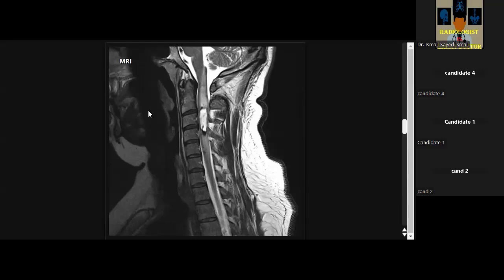To rule out what other lesions do you want to look for in such a case? If it were syndromic, for example, there might be other features to suggest neurofibromatosis type 2. Excellent. Okay. I will answer after all 4 cases.